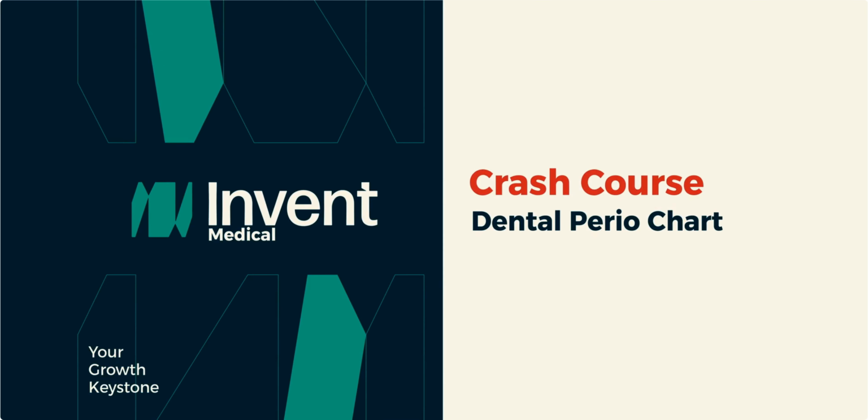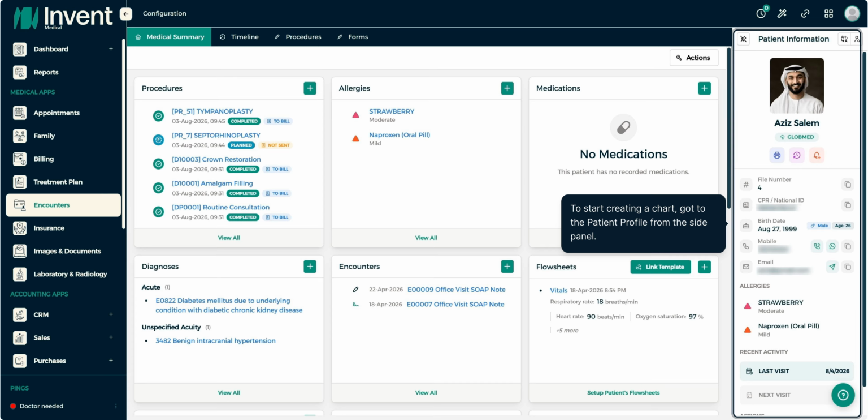Welcome to Invent Medical's crash course on the Dental Perio Chart. In this video, we'll walk through a general overview of the chart, how to start a periodontal exam, record measurements, and more. To start creating a chart, first go to the patient profile on the side of any module.